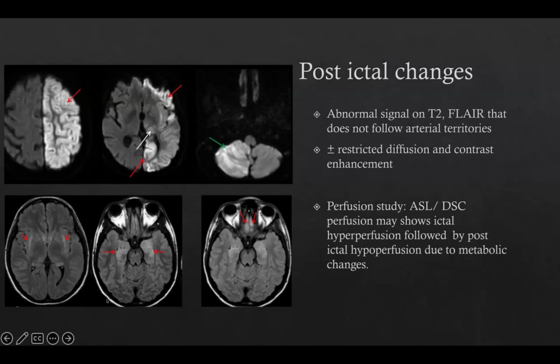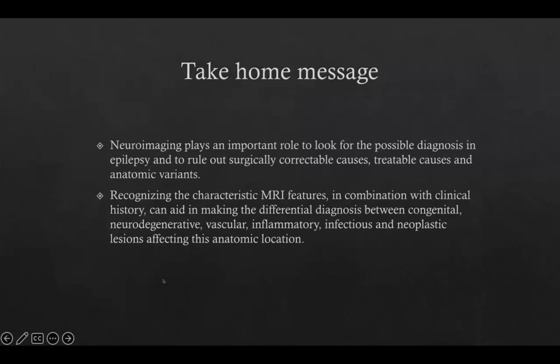And the lower image, what you can see here is more symmetrical at the putamen and at the mid-temporal lobe. But with time, after 6 days, these changes have started to show some resolution. So this is more of post-ictal changes.